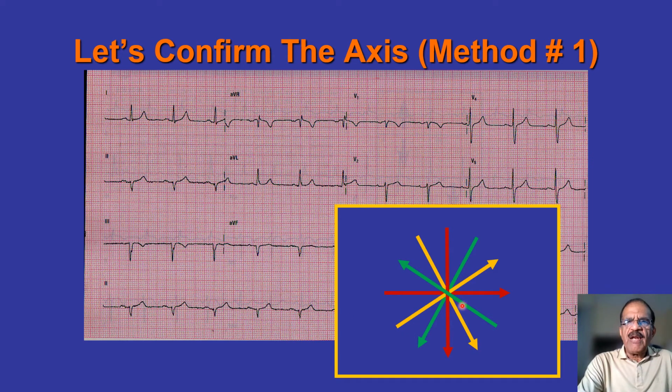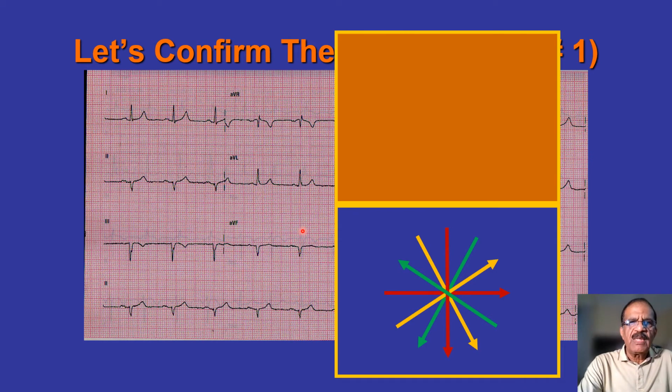And this right angle means that if the QRS complex is biphasic, for example in this lead, with both upward and downward deflections almost equal, then the axis is along this lead, either this way or this way. So I think we're going to repeat this exercise. Now let's see what is our first observation. This shows the pair.